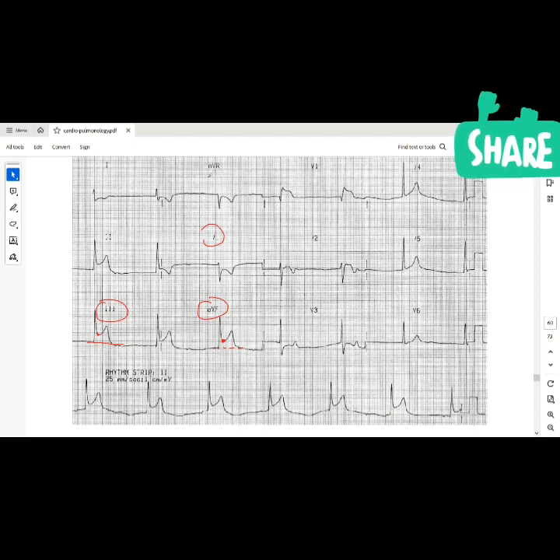Remember, I told you all the ones with the Roman numerals follow each other: 1, 2, 3, then AVR, AVL, AVF. Right? So what does AVL have? You say inverted T wave. Okay, what else does it have though? Doesn't it have ST depression as well? You see that or not?